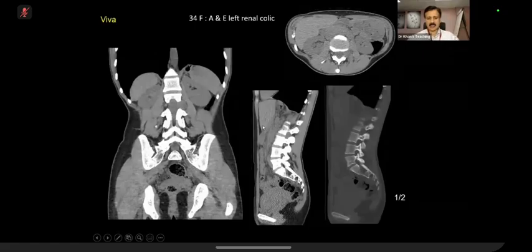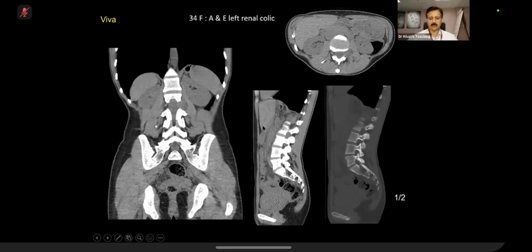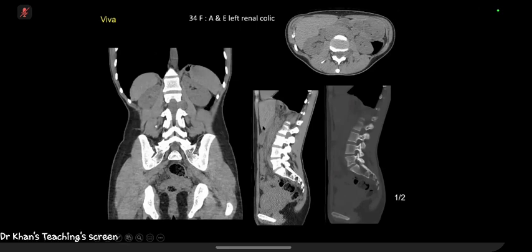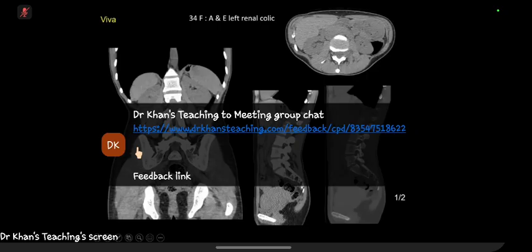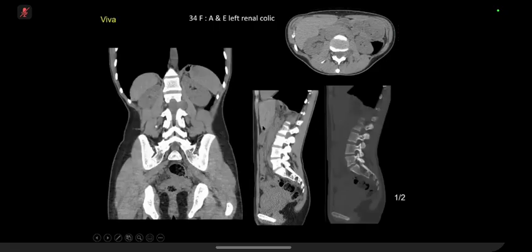Now on this CT scan, it's a bit harsh, but on a CT KUB, can you see anything looking into the spinal canal? So there, in the axial single image, there's expansion of the foramina on the left. And what will you be worried about? So in this situation, it will often be a neurally based lesion, a neurofibroma, or a schwannoma. What would you like to do? If we have a patient still on the table, I can advise a CT with contrast. Otherwise, not.